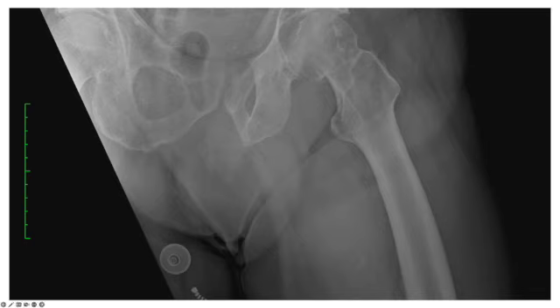Great. Hopefully most of you can appreciate that there's a sclerotic line involving the subcapital region of the left femoral neck. We also have an acute angle along the medial aspect of the femoral head-neck junction, which is a sign of an acute fracture. If we look at this radiograph, hopefully most of us can appreciate that the femur is held in flexion and slight external rotation. This is due to an unopposed iliopsoas, and this makes the lesser trochanter more prominent. This is commonly the position the hip is held in when there's an acute hip fracture.